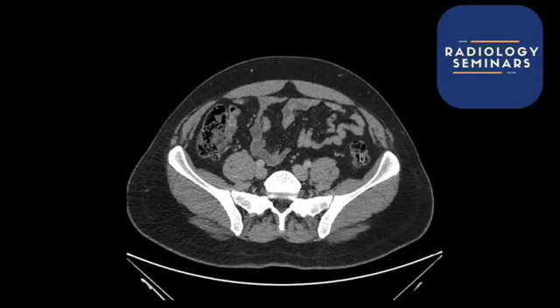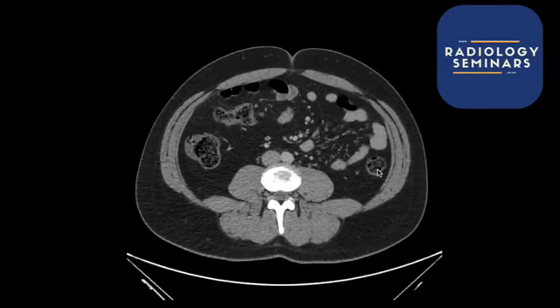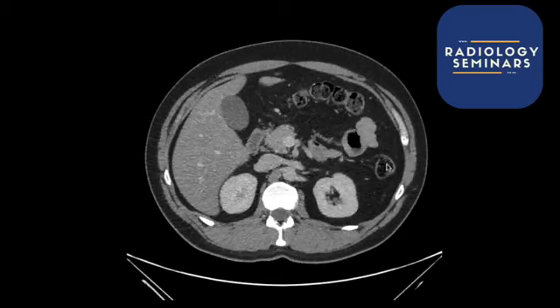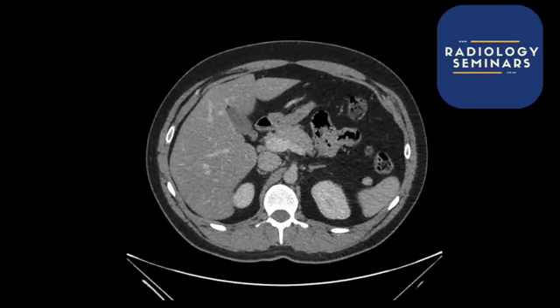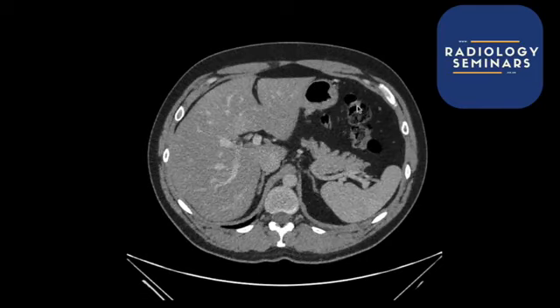Yeah, and you look, I'm still here, and it's going upwards. I'm going to keep that mouse there. I want you to keep your eyes there. And this is how to track, I think they call it tracking the bowel, following the bowel. You want to go up, and look, my arrow doesn't have any bowel in it anymore. So you want to come up and down. Oh, okay, there's still a bit of bowel. Where does it go? Oh, it's going this way. So now we're at the splenic flexure. Spleen, flexure, splenic flexure. Okay, we're over here, coming across.